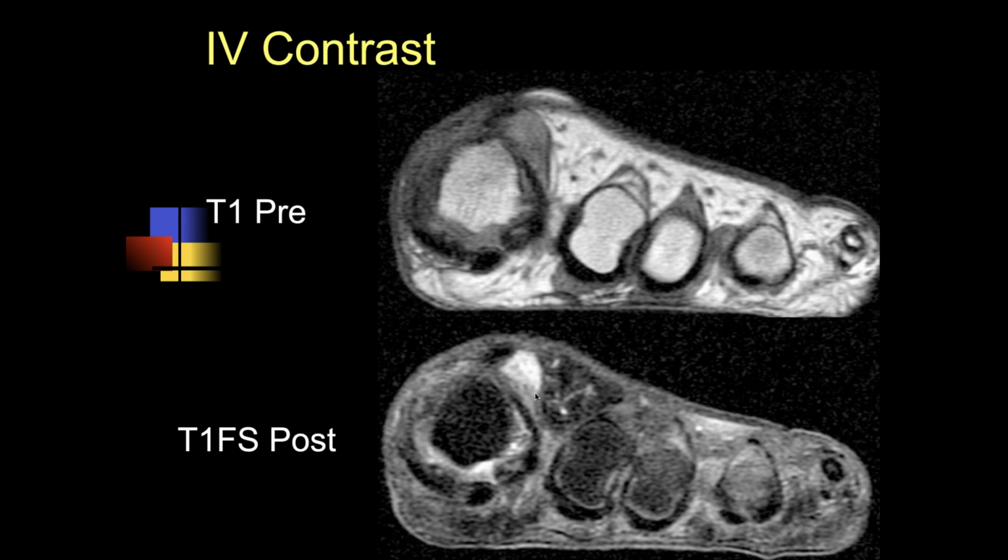I don't think you can compare these two, though. Okay, so the concern was whether, well, I presented this incorrectly. So the patient had pain and also a palpable mass, and here are the first two sequences. And so you picked this up and you thought it was fluid. Yeah, because I wouldn't compare the post contrast T1 fat sat to a non-fat sat T1.